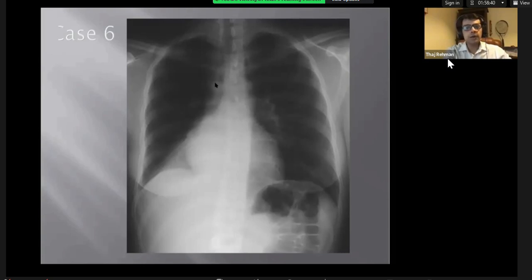You can see the airway, the right main bronchus, very well up until the hilum, which means that it's not obstructed, which will not be, because the obstruction is to the lower lobe bronchus, which you can't see in this X-ray. So you correctly identified all the abnormalities, tracheal shift, mediastinal shift, only bit was that the medial end of diaphragm is actually silhouetted. So it's possibly a right lower lobe collapse with hyper-expanded right upper lobe. Okay, yes, good.